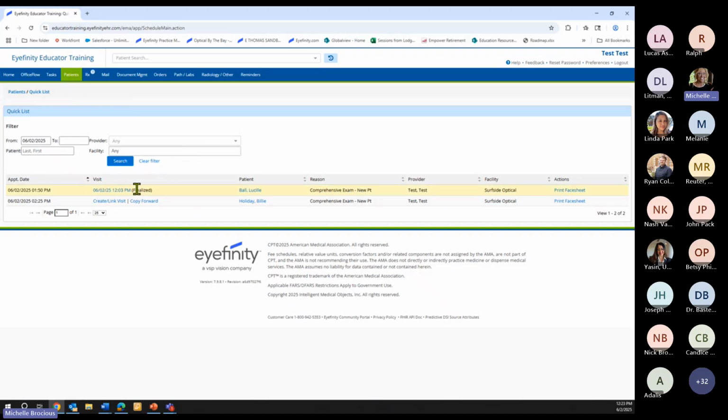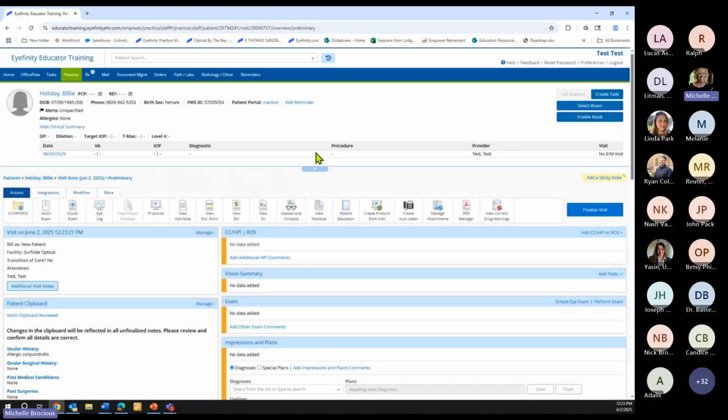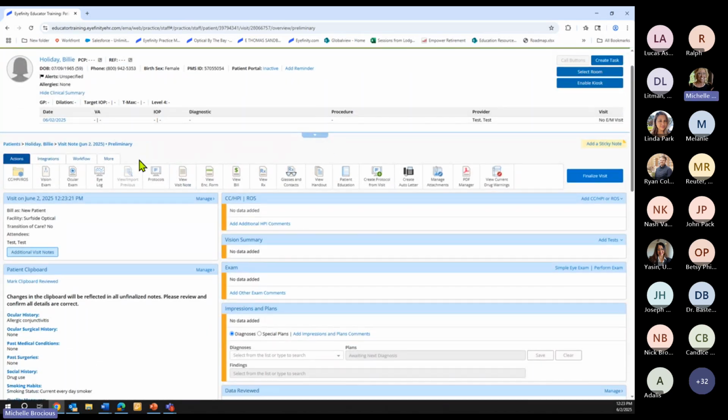So I used my one patient, Lucille, earlier. You'll notice that one's finalized. So for the browser version, I'm going to go ahead and use Billy here. Okay. So I'm going to go ahead and create my link visit, and that opens up my exam for me.